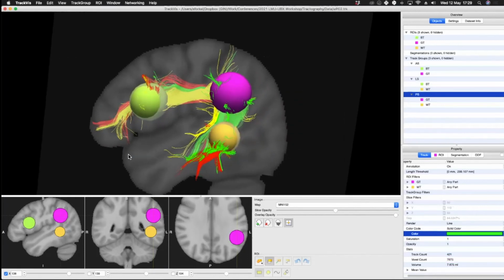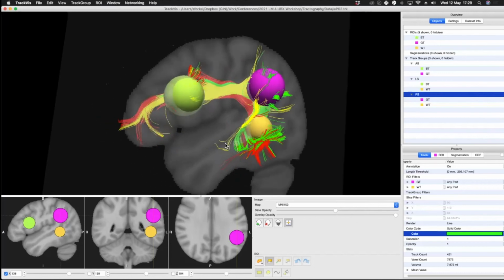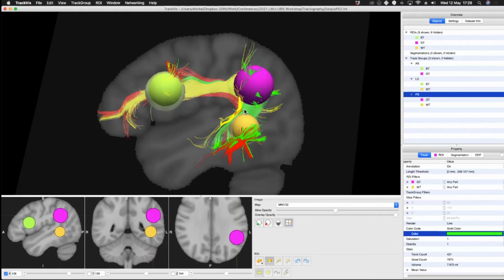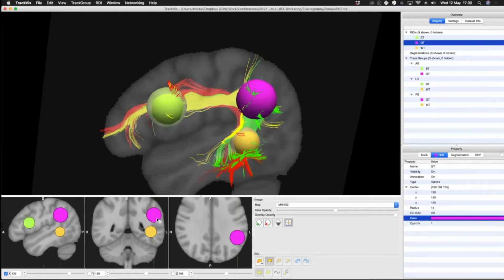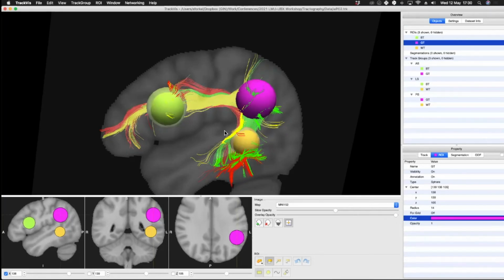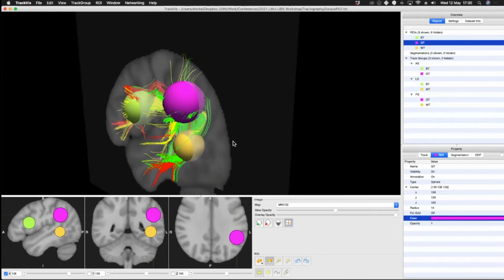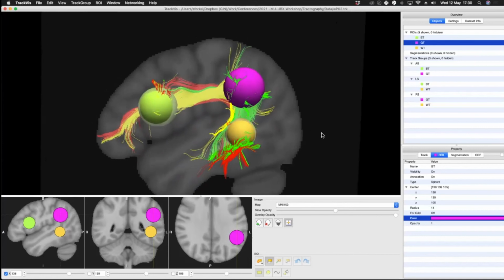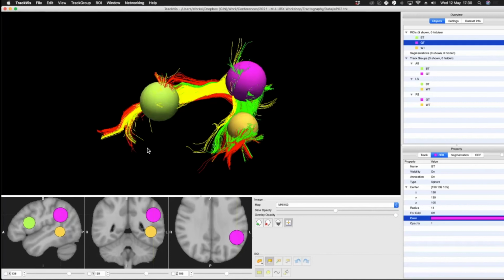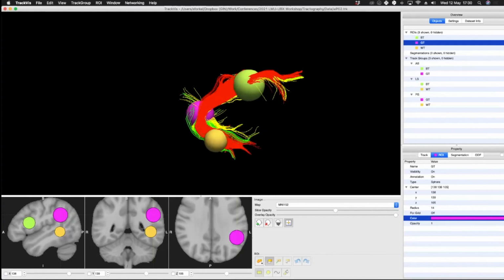So now you see something that resembles the 3 segments. My anterior segment spills over a little bit, but you now know how to fix your reconstructions by placing not regions. So I'm just going to leave it for now as it is. Just going to untick the plane so you see the tract.